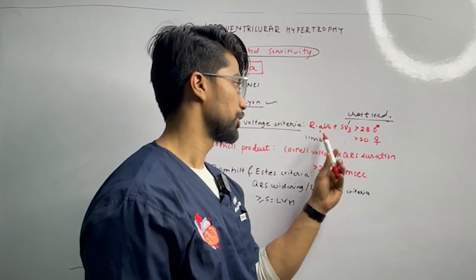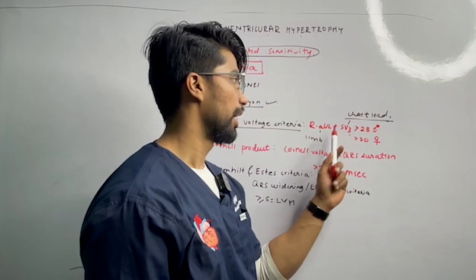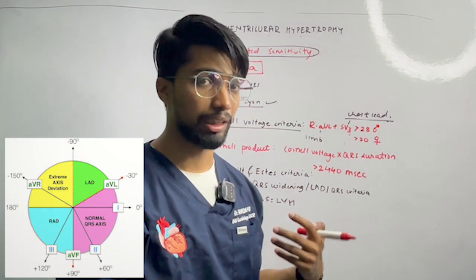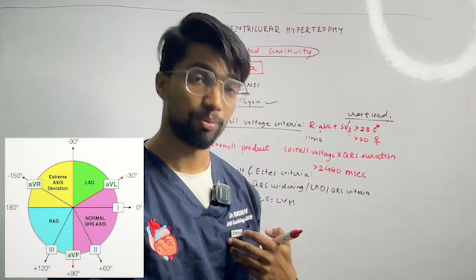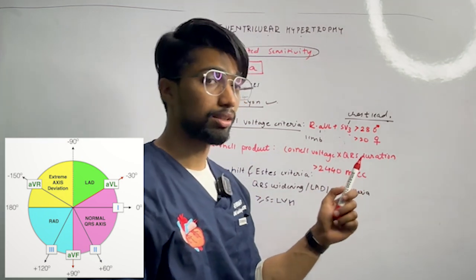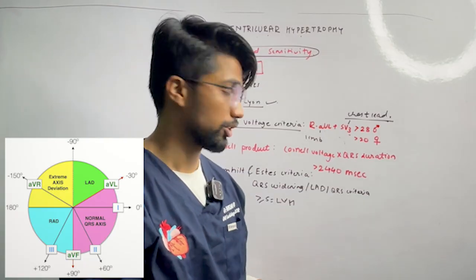And just remember, it has both limb leads and chest leads, and V3 and AVL are not exactly opposite leads. One is in the lateral direction, one is most anterior, but still the criteria applies, because the LV grows in lateral and anterior directions.